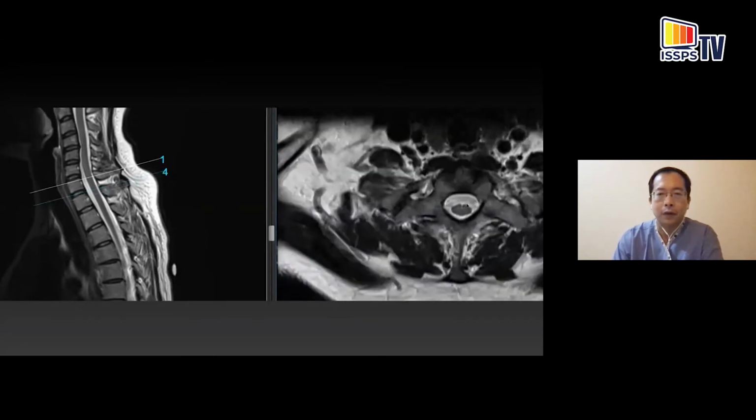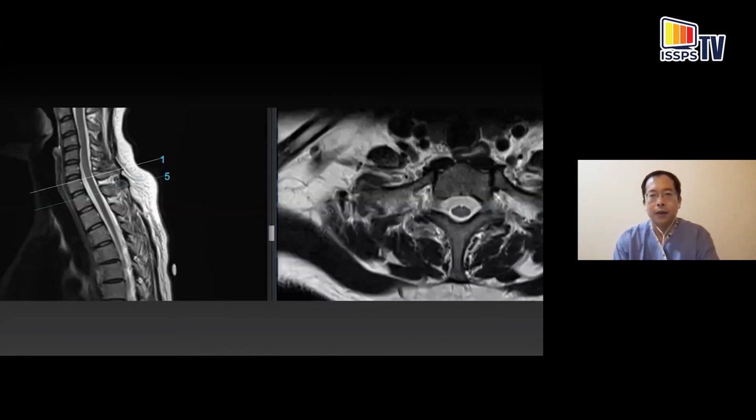So now this is at T1. We're just going to do a quick scan all the way down on MRI. Now, here's the tip of the spinous process at the top here. This is going to be just at C7. This is going to be the T1 vertebral body. Watch this. As we go down, this is the T1 transverse process, still looking fairly similar to a cervical spine. You can see the T1 rib taking its shape here.